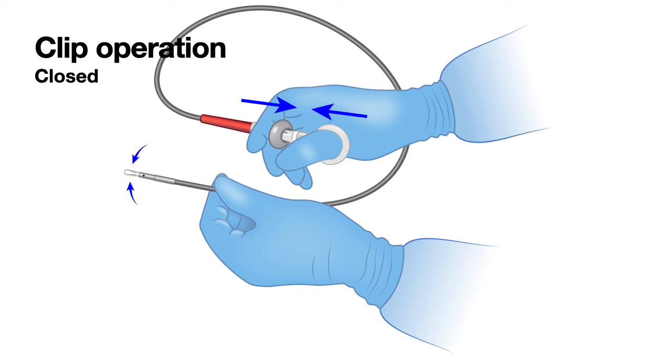As an assistant who is assisting the endoscopist, when the endoscopist is dealing with a bleeding, it is important to make sure that your clips are readily available. You take them out of the packet, uncoil, and be ready to hand over the clip to the endoscopist in a closed position.